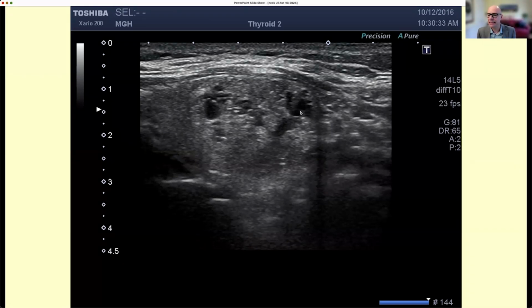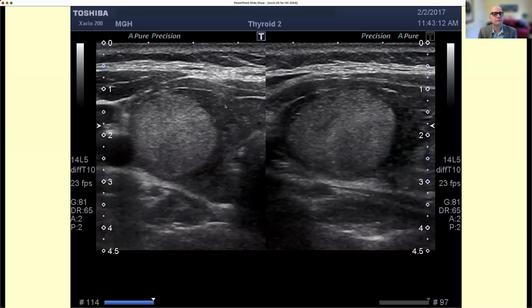Any questions on that? What I'm trying to show here is that sometimes things cannot be very efficiently categorized, and sometimes we have to have some marginal doubts on the images that we see. The nodules don't always read the books, and also the equipment that we use is sometimes different, and so they generate artifacts that may be different. Any taker on this one?